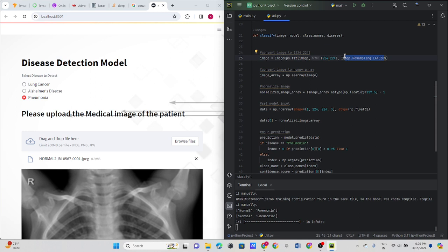So it is very important that all the images you extract are in a particular format. The format may be anything, but for resampling, that format is basically the size compatibility which is being implemented here.